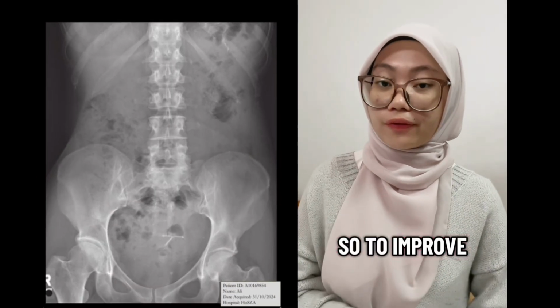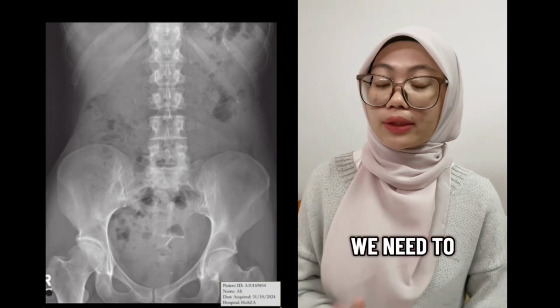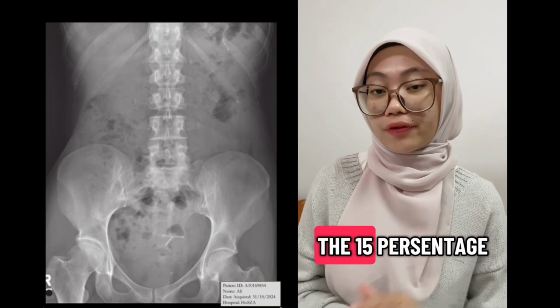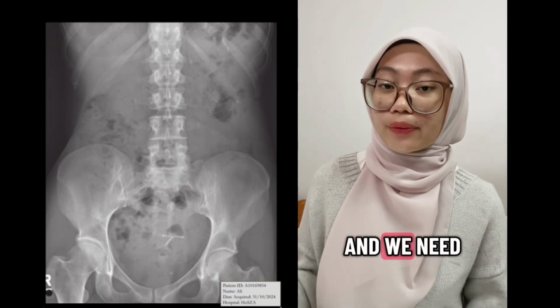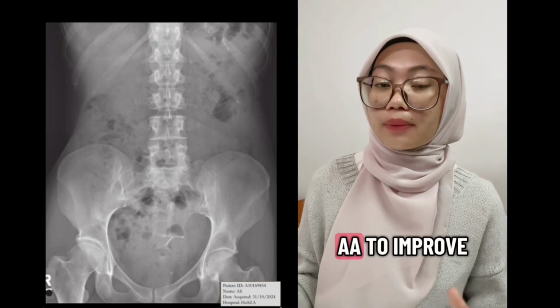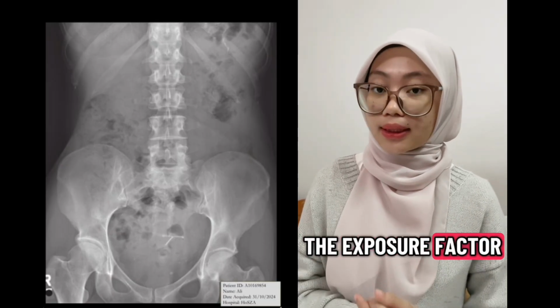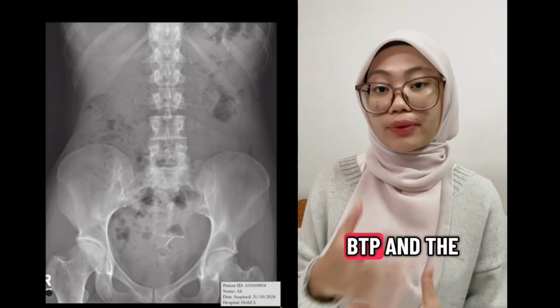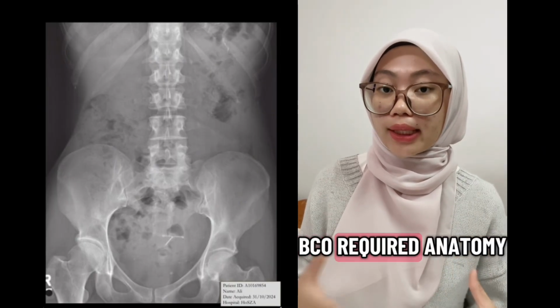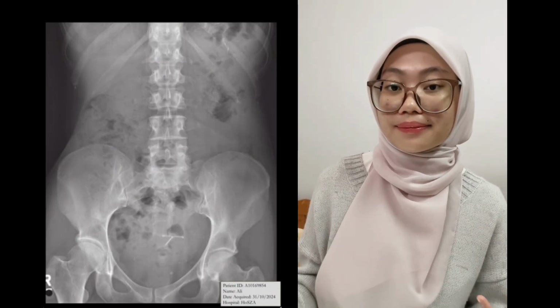So, to improve the exposure factor, we need to decrease the kilovoltage by 15%, and we need to double the milliampere second, so that all the bony trabecular pattern and the bony cortical outline of the required anatomy are clearly seen.